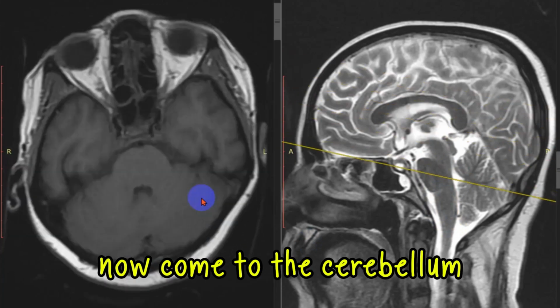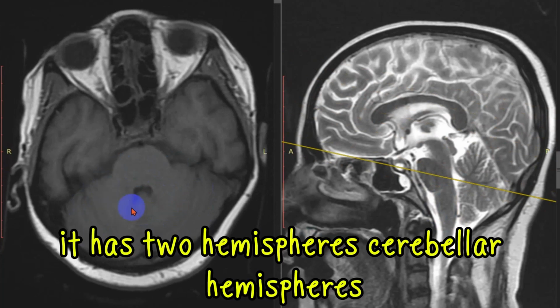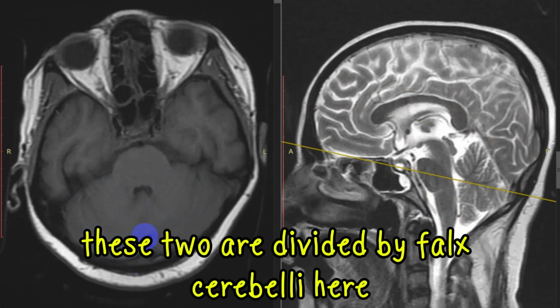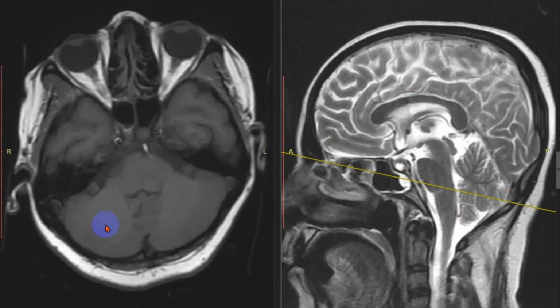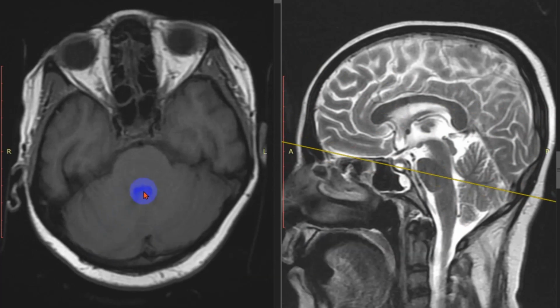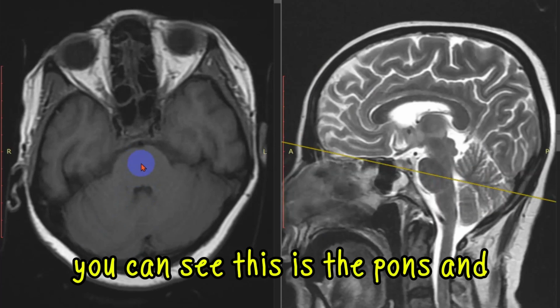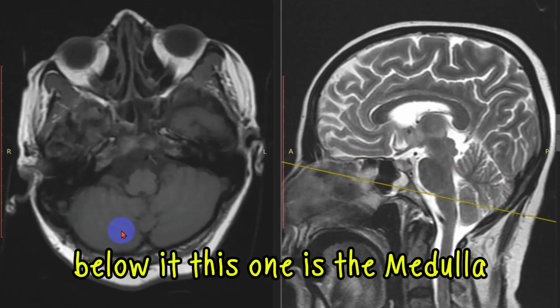Now come to the cerebellum. Here we can see this is the cerebellum. It has 2 hemispheres, cerebellar hemispheres. These 2 are divided by the falx cerebelli here. Within the cerebellum we can see this is the 4th ventricle. Here this part is the pons. You can see this is the pons, and below it this one is the medulla.